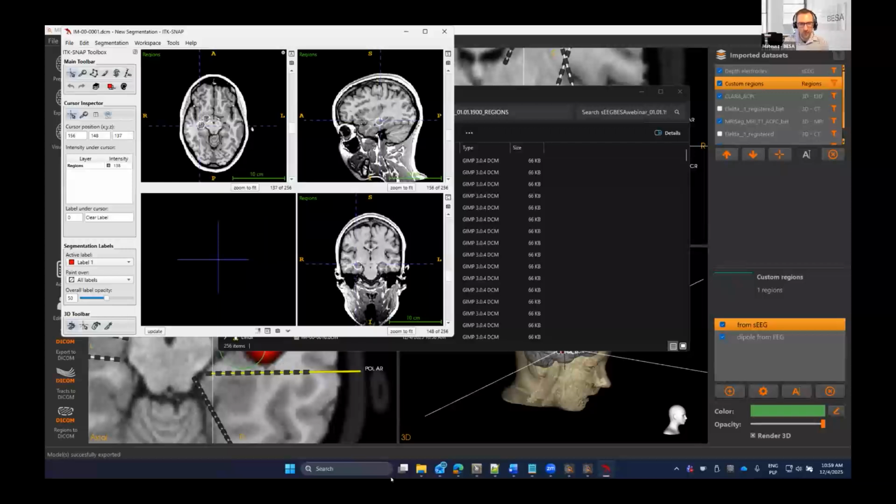So the long story short, we make a big tour from the raw EEG to the results that can be used in neural navigation system. And with this, I would like to finish here, and I'm open to answer any questions if they arise.